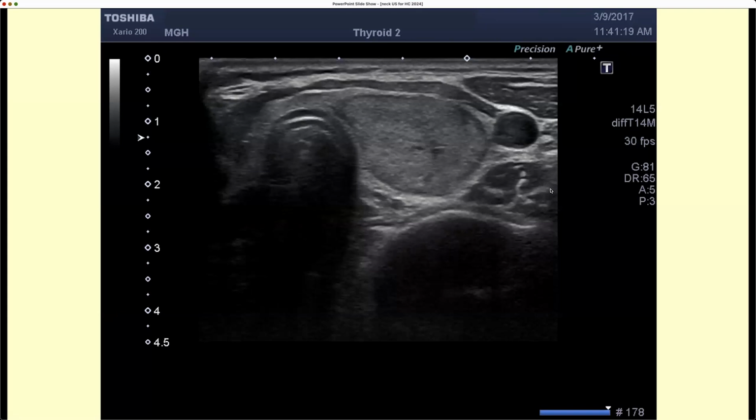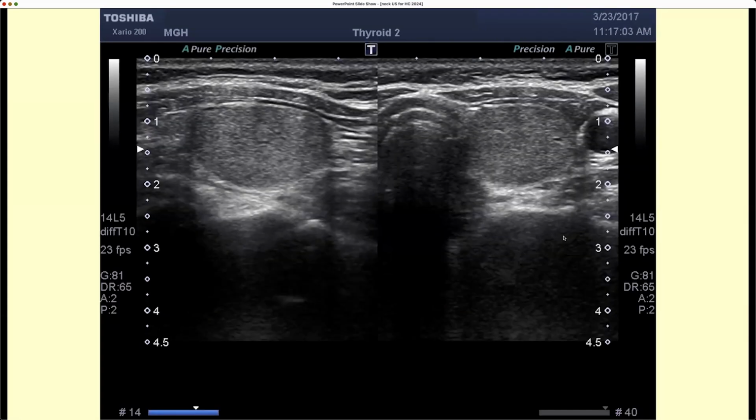I have a question. As far as the margin on that, neighboring the trachea, would you consider that to be ill-defined, or you kind of see the rest of it, like the other three quarters, how it's round, and you would just say regular? So I think the margin is regular. You have to remember that the trachea generates a little shadow because of its structure.